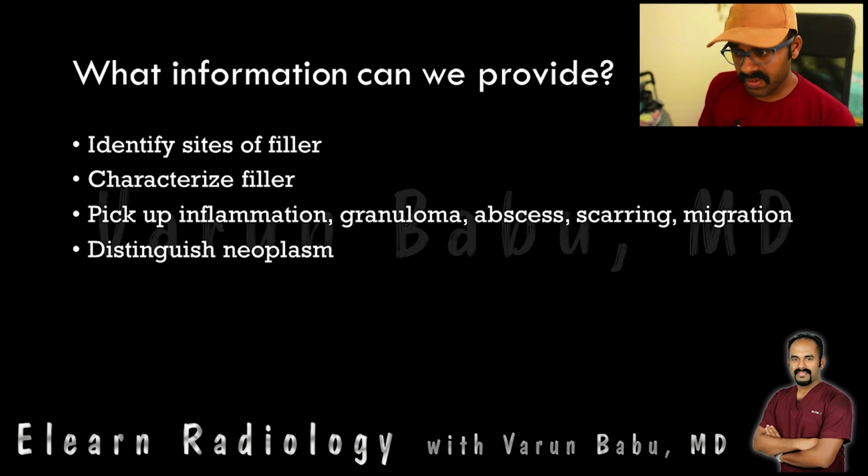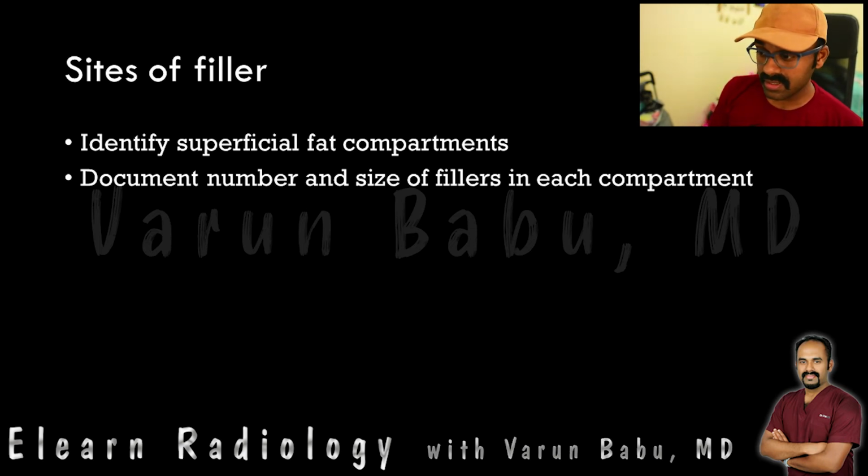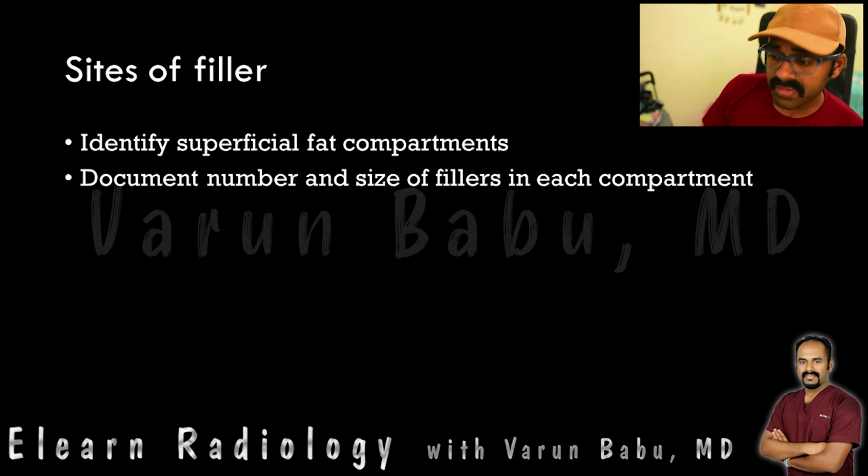What information can we provide? We can identify the sites of the filler, characterize the filler, pick up inflammation, granuloma, abscess, scar formation, and even identify underlying neoplasms. So, document the sites of the filler with respect to each superficial fat compartment, where in the 9 compartments they belong to. Document the number and the size.